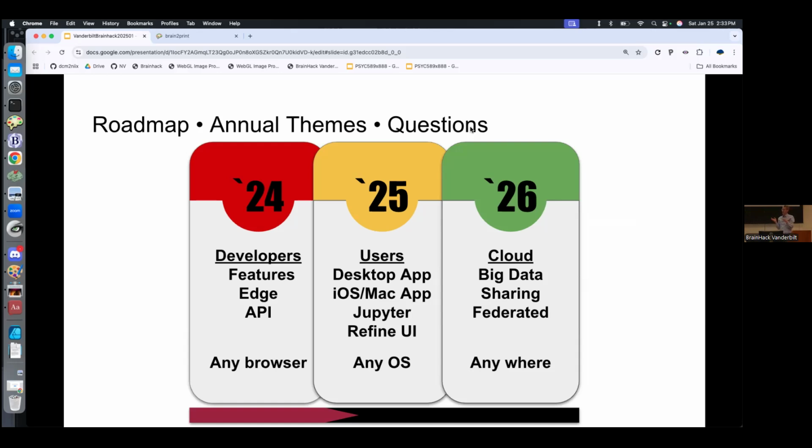So it works anywhere. So it does make a good desktop app if you don't want to share it. I was showing you the edge-based stuff that can do AI on the edge without having anything leave the local computer, but it's just as well a tool that you can run in the cloud, to use your cloud service if you want your data to live there.